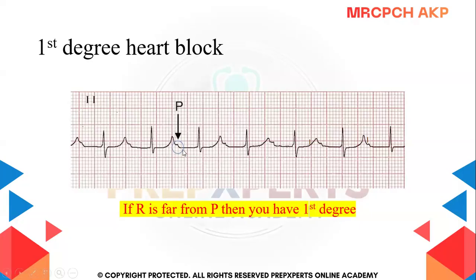So you can see that there is prolonged PR interval. See here and then here. And in some places, you can see that it has merged with the T wave. Okay.